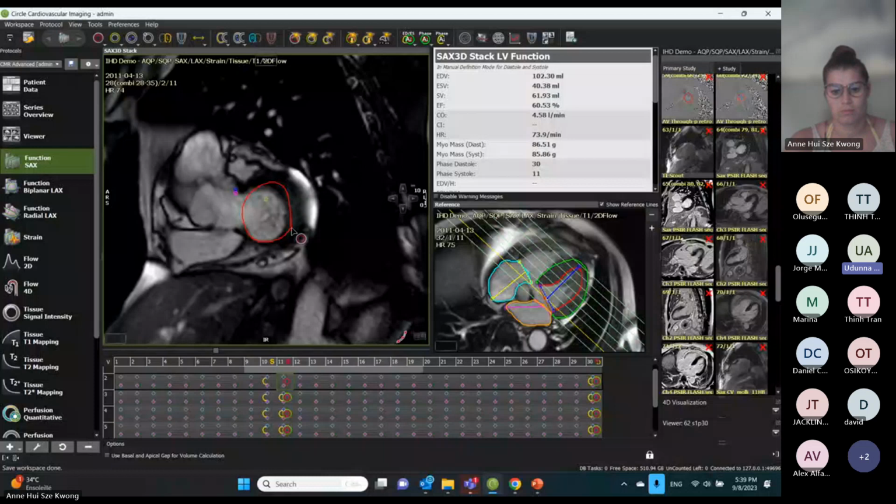Right. And I see that when you do that, it makes all of them X or red, or canceled, on the right-hand screen. Is that because once you apply the contour, it will give you that green check mark again? So as soon as you change the contour, here on the short axis, you will have an updated report automatically.